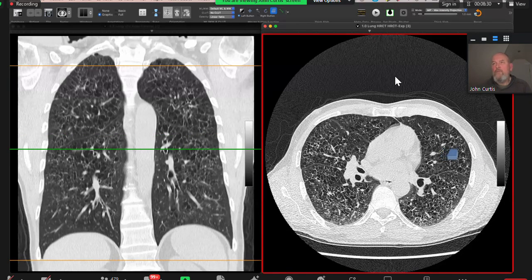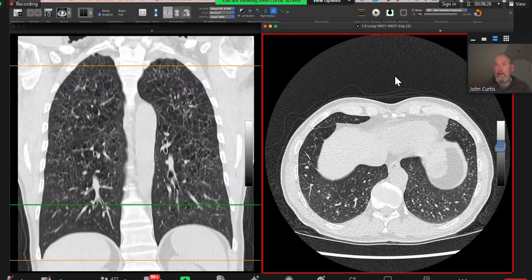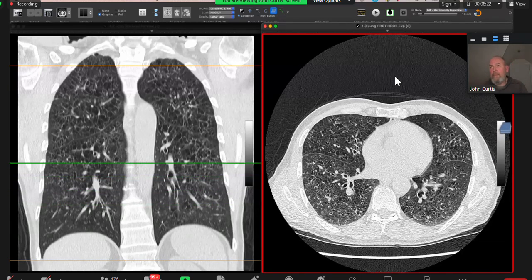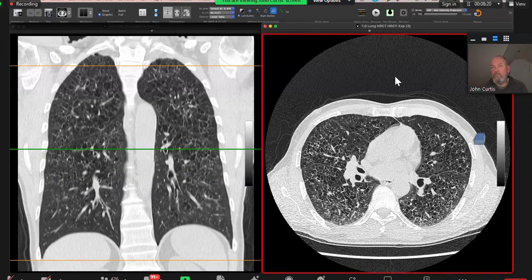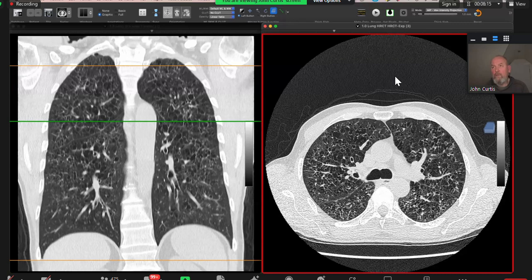Okay. Are they random or centrilobular? No, they're random. They are bizarre-shaped as well. And are they different shapes and different sizes? Yes, and slightly nodules too? Yes, they're nodules too. So if there is any history of smoking, this could be LCH.